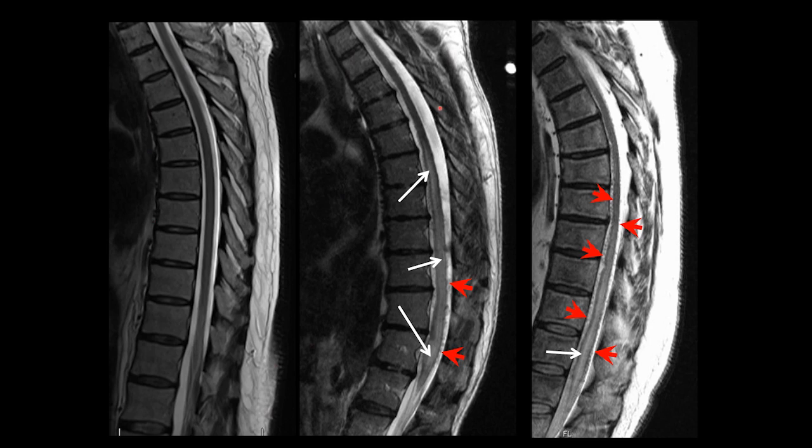Now we see that the spinal cord is abnormal, with new flow voids around the spinal cord, and the spinal cord is also enlarged. The reason is that the spinal cord is suffering from venous congestion, and the vessels that you see enlarged around the spinal cord are increased size venous spinal intrinsic vessels.